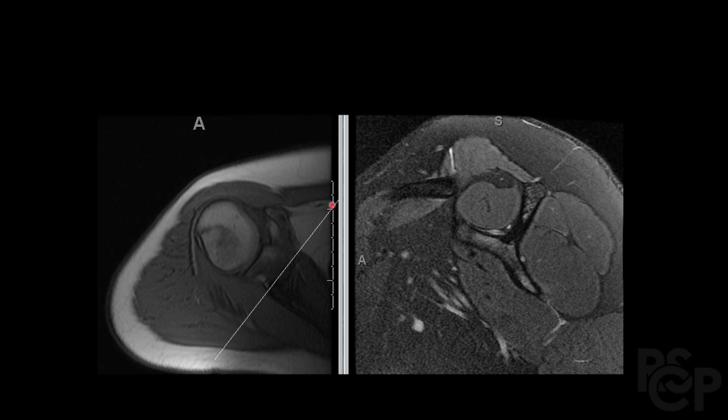Okay, and lastly, this is the sagittal oblique view, this is the axial orientation. We can see how the slices are being cut in this manner. This is perpendicular to the coronal oblique view, which we saw earlier, where the slices are being cut in this manner. So it's perpendicular to this white line. And again, these are more anterior structures, and these are the posterior structures. This view is a little bit similar to the plain film Y view. So if you can kind of imagine that, it might make it a little bit easier.